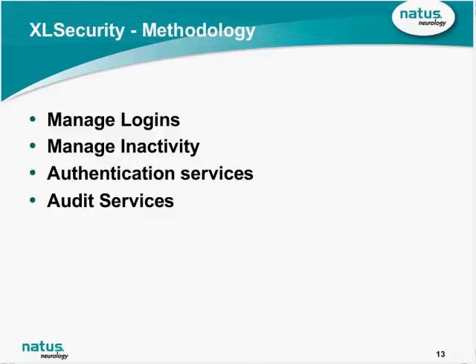So if you want to go back in time and find out what a particular user was doing when they were logged on a particular machine, the Audit Services provides you with the ability to look at a report that maintains a log of specific functions performed by that user. It doesn't track every single move in the software, but there are some major functions or operations that the Audit Services keeps track of.